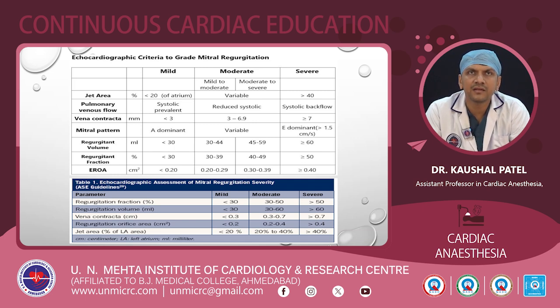There are various parameters like MR jet area less than 20% of the LA, pulmonary venous flow, vena contracta, the mitral inflow pattern like E/A ratio, regurgitation volume, regurgitation fraction, and effective regurgitation orifice area. All can quantify the MR into the three basic grades: mild, moderate and severe mitral regurgitation.